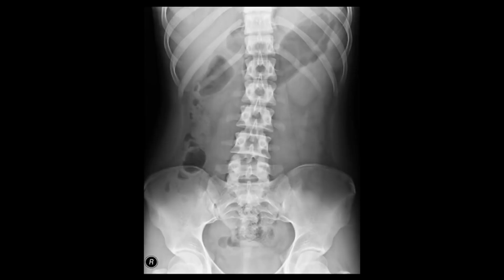As a first year student, you should be able to comment on this particular X-ray. So this is a plain X-ray of abdomen and pelvis, antero-posterior view. As you already know, a proper commenting method should contain mainly 4 points. It is plain or contrast. Second point will be the type of imaging, X-ray, CT, MRI, ultrasound, whatever it is. The third point should be regarding the region concerned. Here it is abdomen and pelvic region. Now the fourth point will be the view.